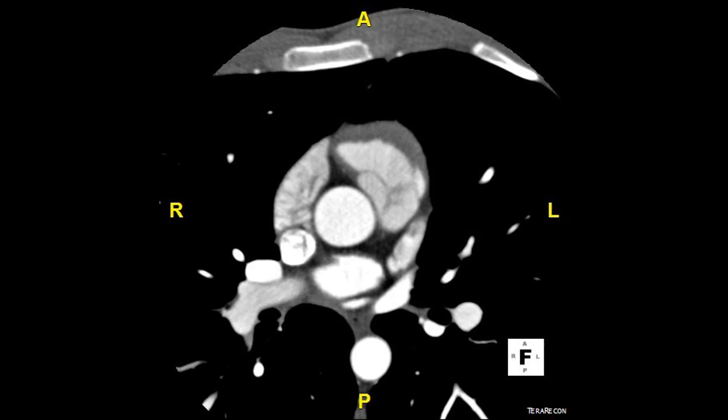This is the first of the two high-yield images I mentioned in the beginning of the presentation. Here's a new structure where the pulmonary trunk used to be, and I'll circle that in orange. And then another structure close to the superior vena cava, and I'll outline that in blue. Keeping in mind the flow of blood through the heart, what chambers are connected to those vessels?